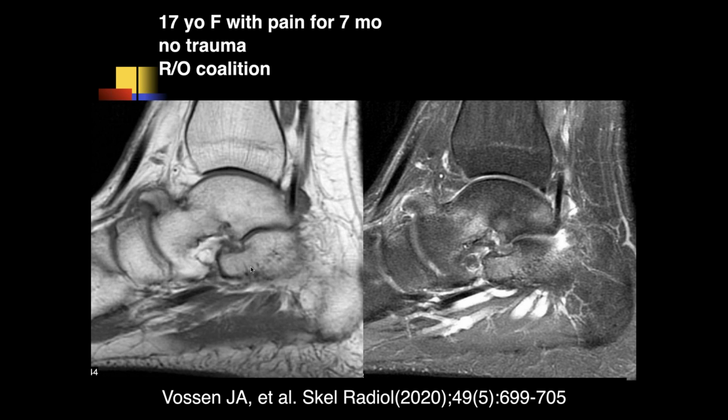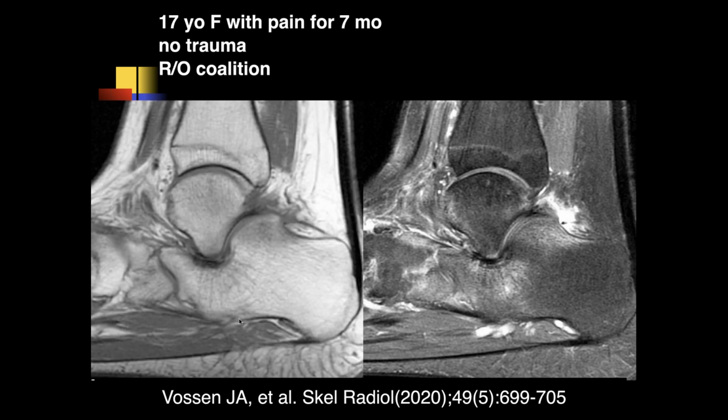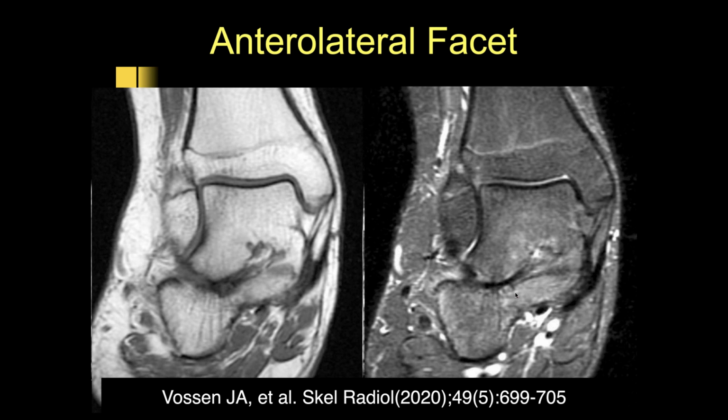Go right here on the right image. See where the white spots are down below. No, below. Here? Yeah, this area is convex, not concave. It should be concave, shouldn't it? I'm not sure. You may be right. Anyway, that doesn't look normal, to me anyway. Obviously you've seen a lot more of these than I have. Okay. Well, I need to look through all the images. Those were just selected images.